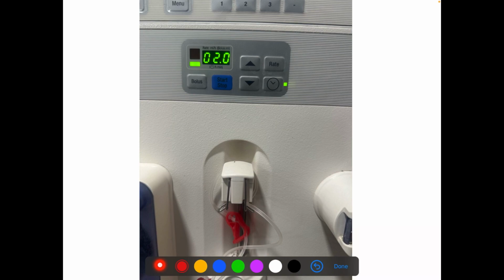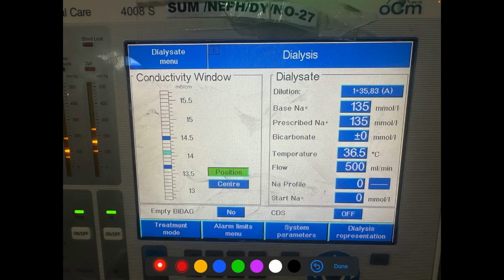Now this, as I told, is the heparin. So heparin, there is a bolus dose after some time that is preset, and accordingly heparin boluses will be given. That is generally added in this machine. We saw it was added post pump pre dialyzer. Okay, in the art line or the inflow circuit, post pump inflow circuit, heparin was infused. Okay, at the beginning a bolus dose is given during the priming of the circuit, and then during dialysis intermittent doses are given.